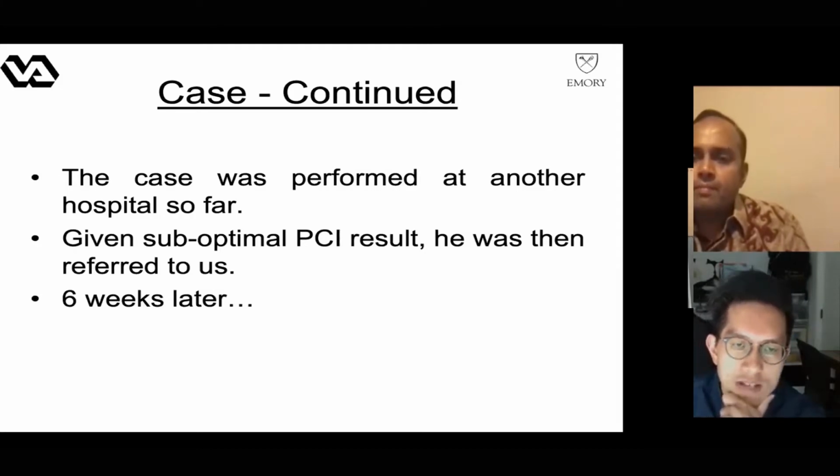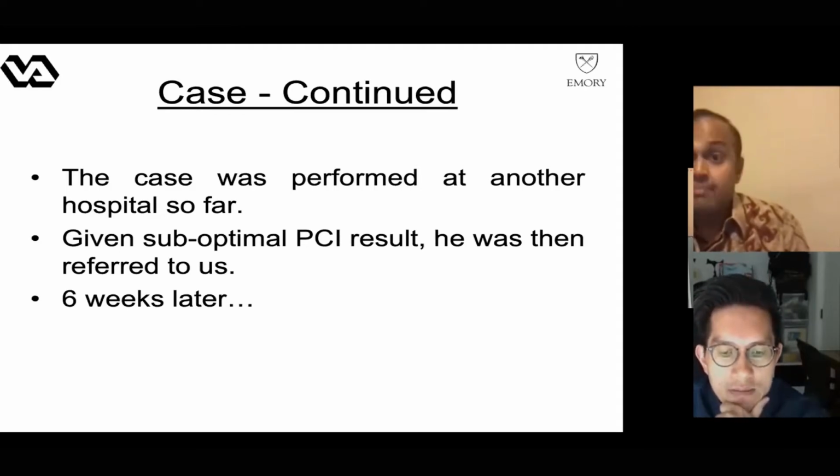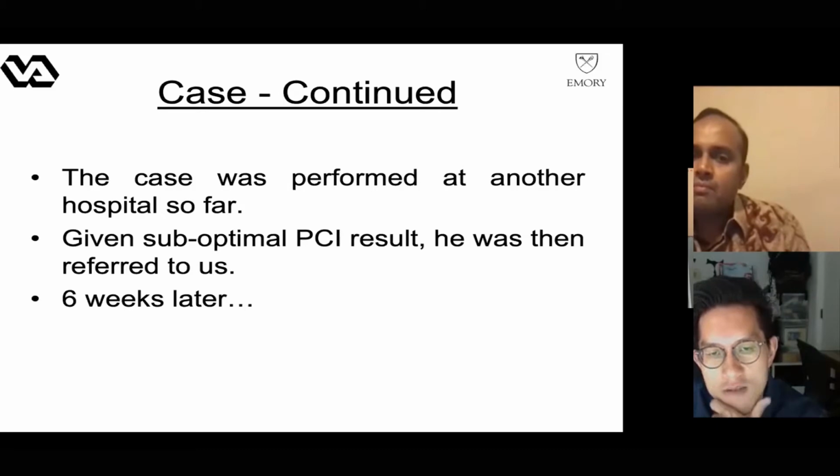And now, of course, with the stent in, it makes your life more tough. To me, the question is how soon we intervene. I think because the stent was just put in, and it's a drug-eluting stent with all the drugs there, I might closely monitor the patient and go in only when the patient has symptoms again. That's my approach. Of course, I can see that the stent is under-expanded, but it is not really bad.